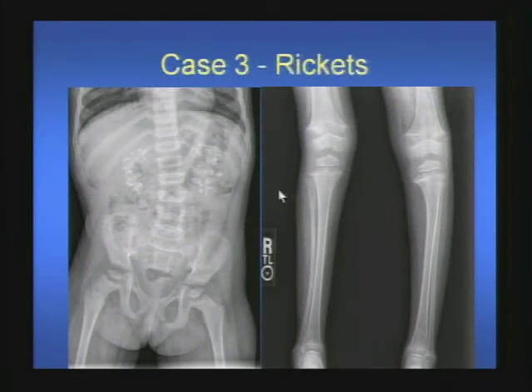This was a case of hypophosphatemic rickets manifesting as bilateral medullary nephrocalcinosis and classical changes of rickets in the form of widening of the growth plate, cupping of the metaphysis, and fraying of the metaphysis. There is also mild bowing of the proximal left tibial shaft. There is a very long differential of etiologies of rickets. I would limit the discussion to this representative case.